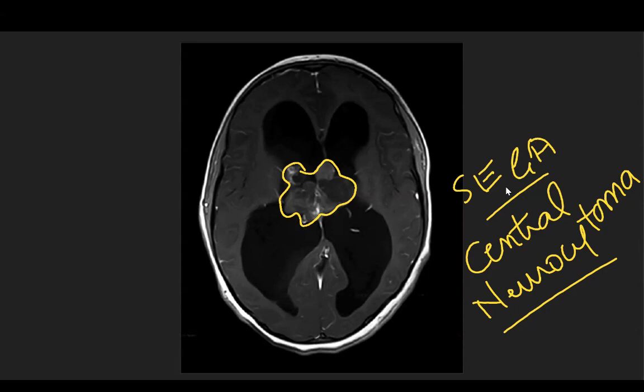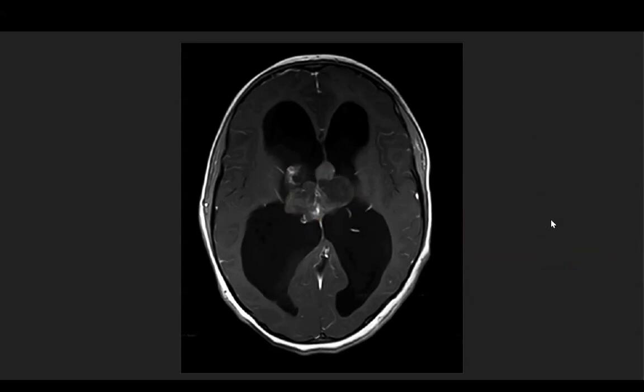SEGA can be there. Then we can also keep choroid plexus tumors as a far-off differential, but we will not think of pilocytic astrocytoma when we look at this radiology. You're going to see a lot of other interesting images as well, and the point I want to make today is how different in presentation pilocytic astrocytoma can be, while the first thing we have in our mind is a cerebellar lesion that is solid cystic in nature with a large cystic component and a mural nodule.